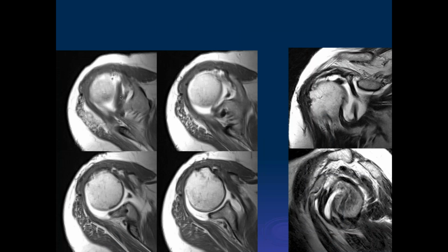So here's the case. Here's a biceps tendon, superior glenohumeral ligament. When we come down here, here's probably the middle glenohumeral ligament, which is somewhat thickened. And here you can see the middle glenohumeral ligament coming down on the coronal images. On the next axial image down, we can see this here, but we don't really see an anterior labrum. Here the labrum is very small, but if you follow this structure, it goes over to the capsule, so that's the middle glenohumeral ligament, but there's a deficiency in the labrum. Here are the coronal images. We can see a big thickened middle glenohumeral ligament, and here on the sagittals we can see a middle glenohumeral ligament coming down to attach to the capsule deep to the subscapularis.